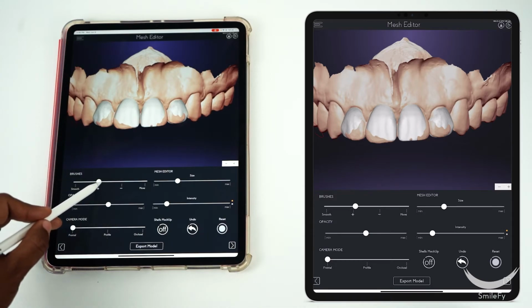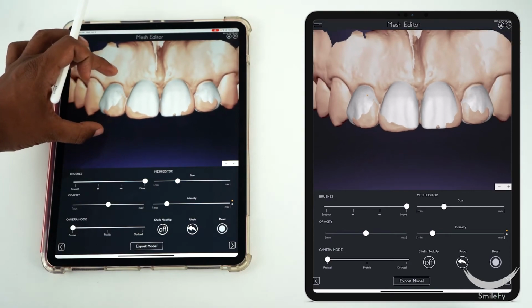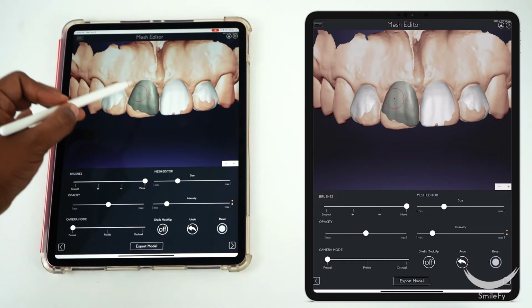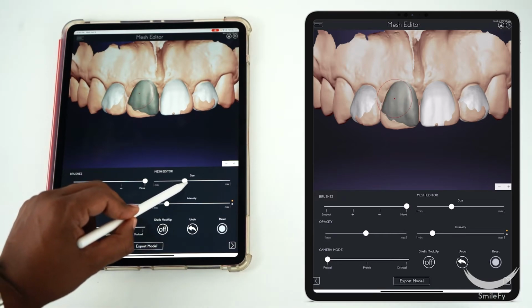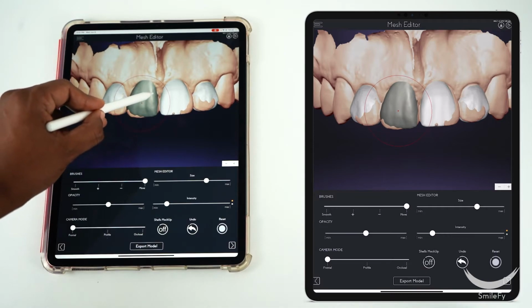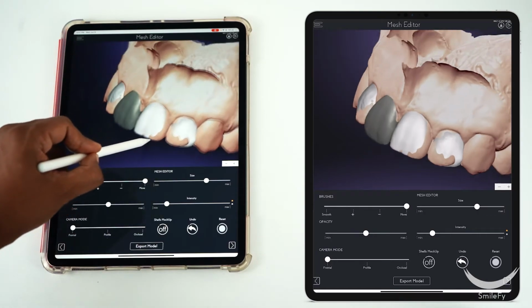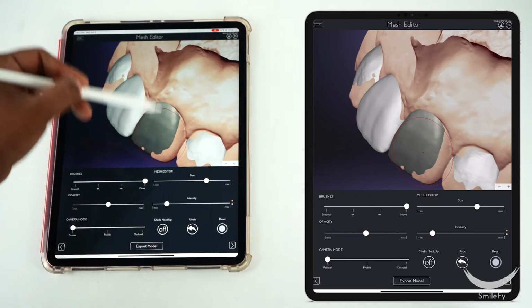Under brushes, slide it to move. So you can tap on the tooth and make adjustments without changing the texture of your 3D design. Change the size of your target and slightly move the tooth around until it feels the entire surface of the existing tooth in the STL.